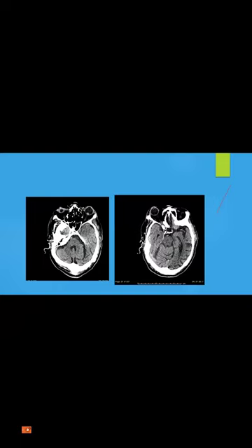Anybody would like to look at this, to take this one? Okay, so this is a trauma case and the patient is unconscious.